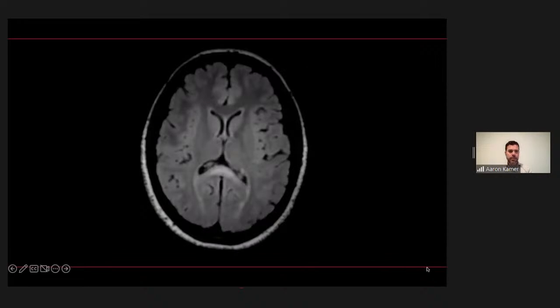All right, let's see. Chris, can you tell me what you see on this image here?